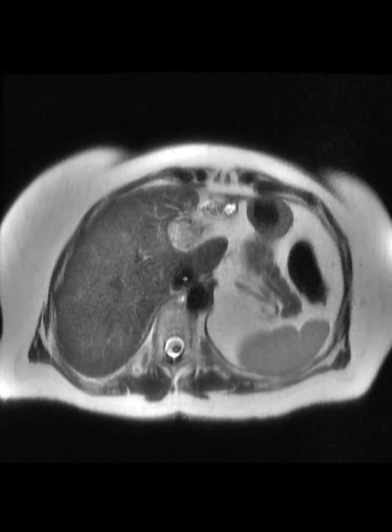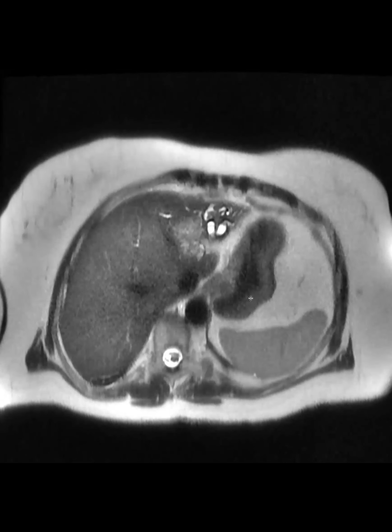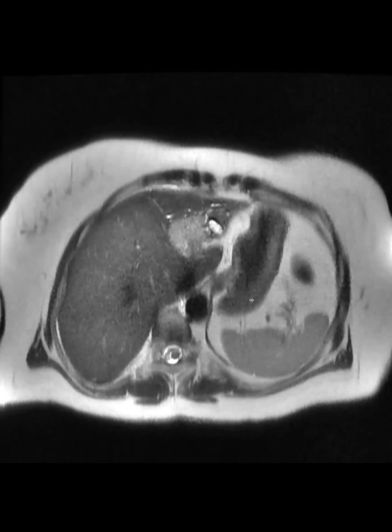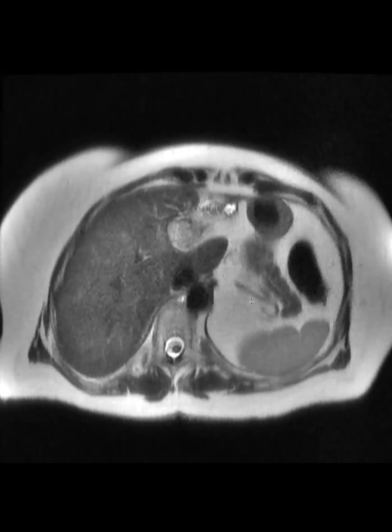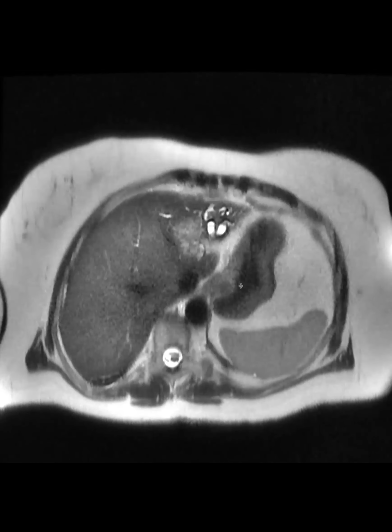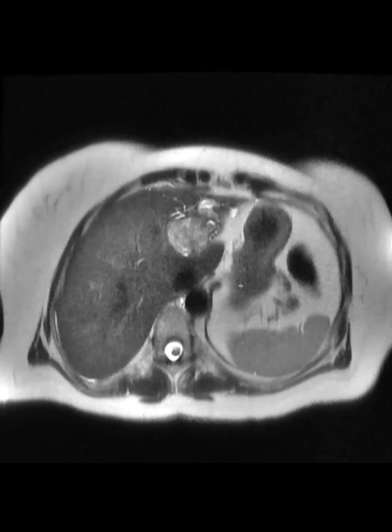Okay, this is a patient with this finding. Cholangio, or some kind of malignancy. Okay. But one thing that I want to point out is the left lobe is atrophic and shrunken with bile duct dilation. So that means that the left portal vein is out.